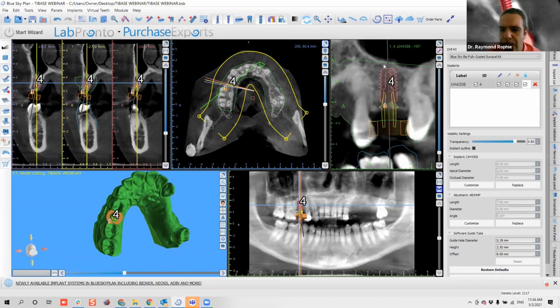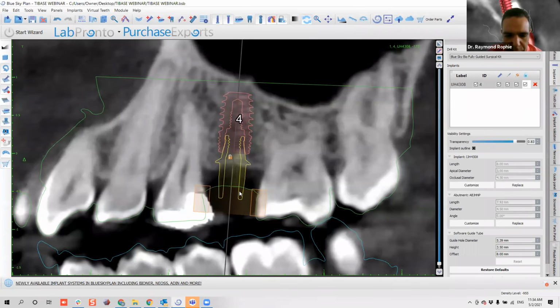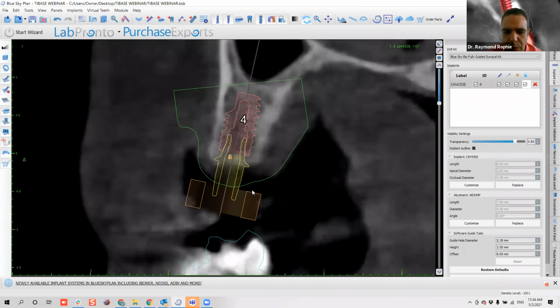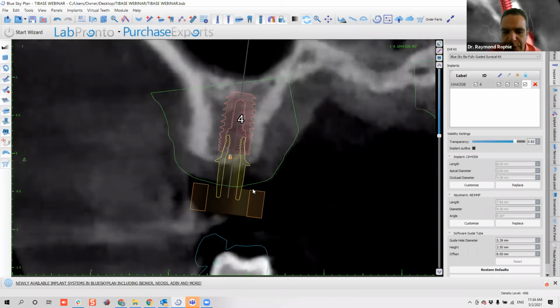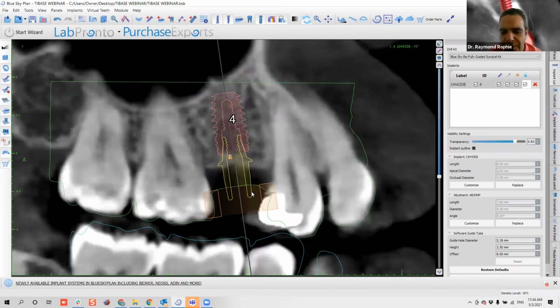we check here on the tangential view. So I will enlarge my tangential view, maximize that window, and check that I have at least the least amount of brown tube impinging inside of the green model, okay? Basically, you don't want your surgical guide to be impinging on the soft tissue, because what will happen is that the guide will not fit perfectly.